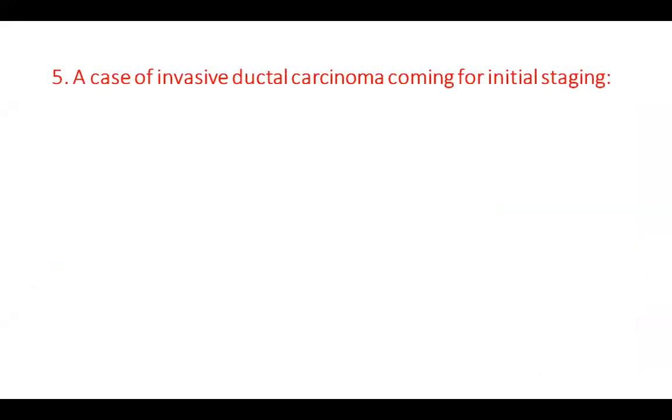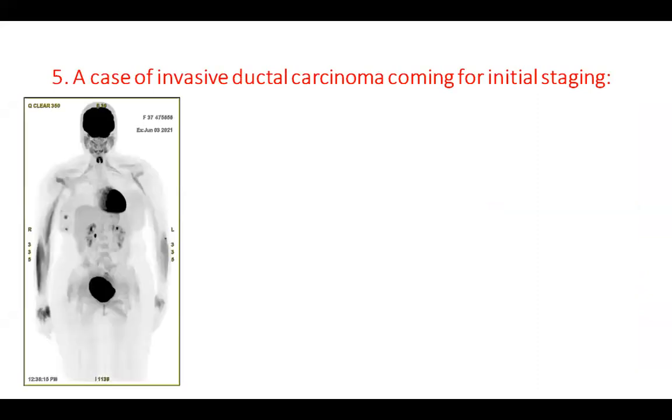This is another case of invasive ductal carcinoma, which was coming for initial staging. As I mentioned earlier, the importance of MRI in terms of breast cancer is not only the verification or the characterization of the lesion, but also the detection of multifocal or multicentric involvement, the involvement of the contralateral breast, and furtherly the whole body survey in assessment of further nodal, osseous, and soft tissue metastatic involvement.